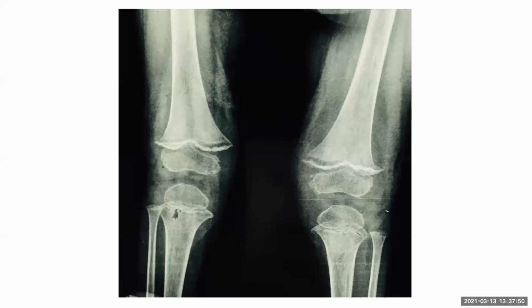Proximal to it, there is also a lucent line. Those lines are also seen, but to a lesser extent, in the proximal tibia. There is also a well-circumscribed cortical ring along the tibial epiphysis. So all those signs indicate that this may be scurvy in this child, especially with the bleeding gums.